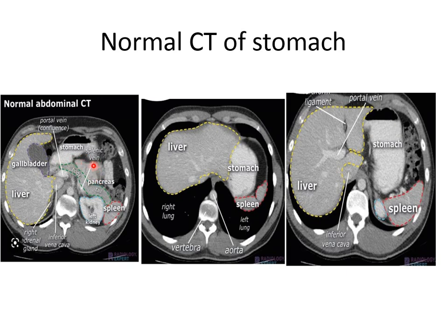Focus on this slice: the stomach's shape will be like that, full of contrast and also gas. On the other side, there's also stomach. Behind it there is the spleen and also the liver. Going more down, this is the stomach and spleen. This one is the colon. Yes, colon. There's no small bowel in this section. So, next slide.